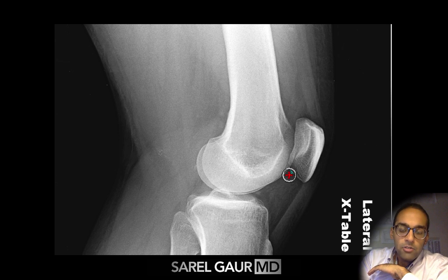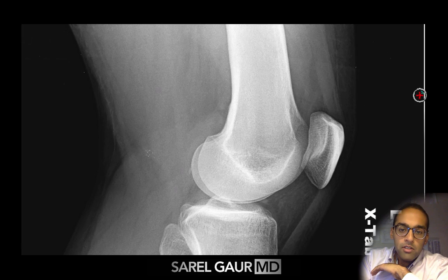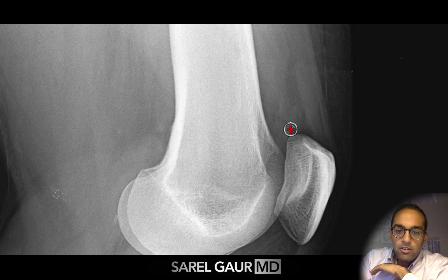I definitely say the lateral view is a very important view on knee plain films. I basically look right here and look for any evidence of a joint effusion. If I see a joint effusion, it could be degenerative in etiology. It could also mean that there is a subtle fracture of the tibial plateau that's leaking marrow, fat, and hemorrhage into the joint space.